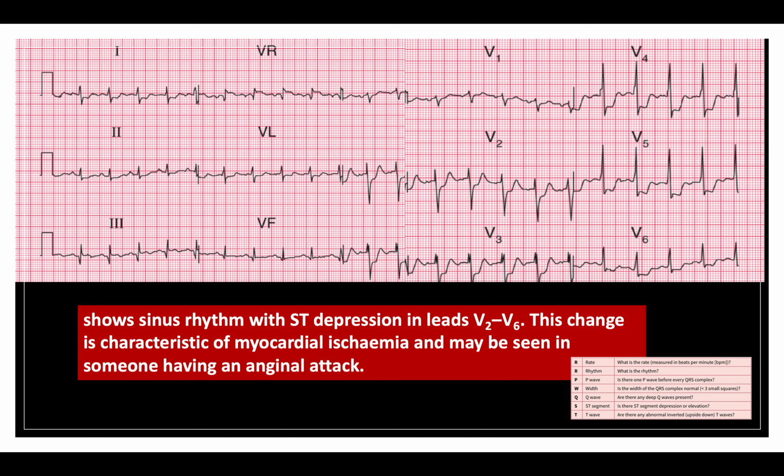Now let's look at the rhythm. The rhythm is constant. We have 2.5 boxes here, 2.5 boxes here, 2.5 boxes here between the RR. Remember, the rhythm is the number of small boxes between each QRS complex. Here it is also regular, roughly 2.5, 2.5. Randomly take a lead, V4. We have 2, 2.5. Again 2, 2.5. So you can definitely say it's a regular rhythm.